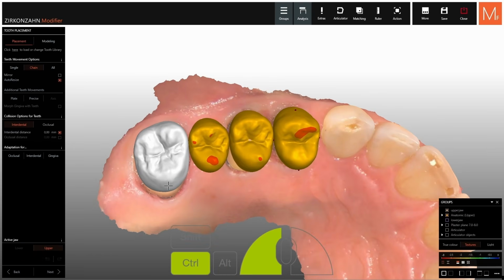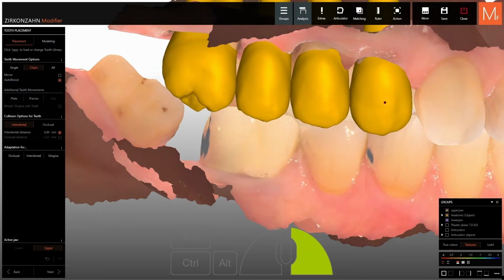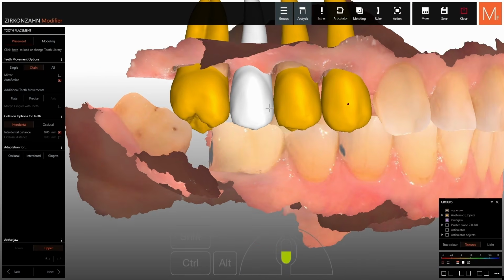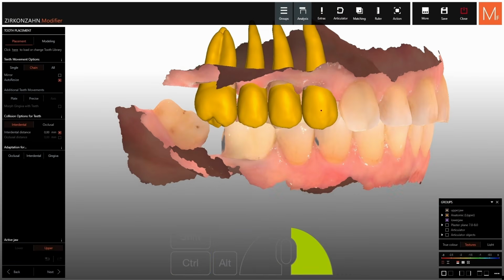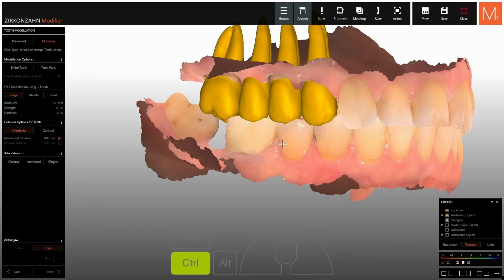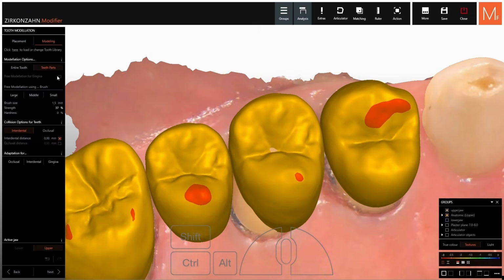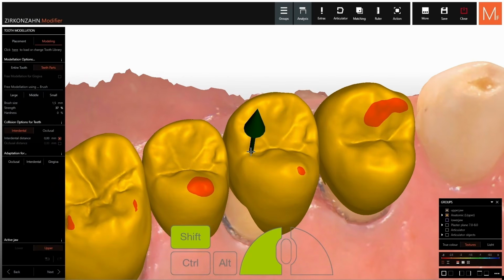We make sure we have proper contact points and briefly check the lower jaw. Once the basic setup is finished, we move to modeling and start freeforming. Using the Teeth Parts tool, we shape the tooth to match the die while pressing Ctrl or Shift. With that, we can work very precisely.